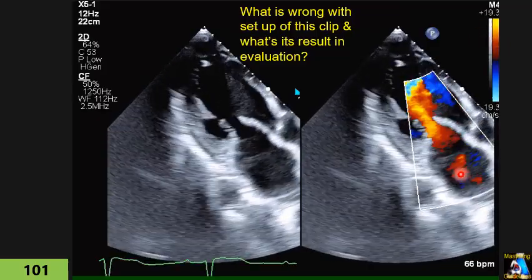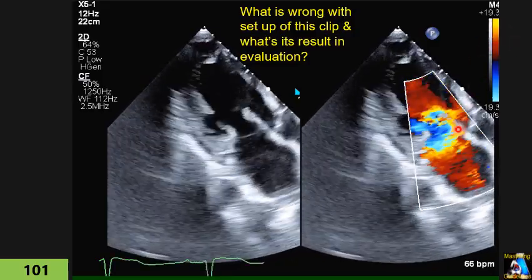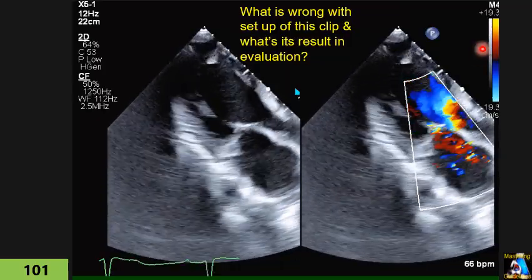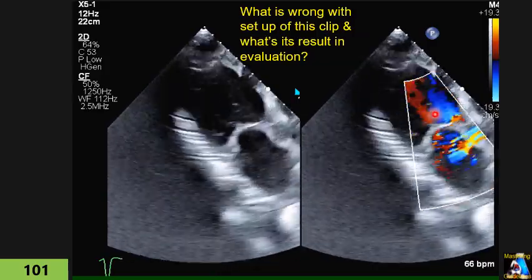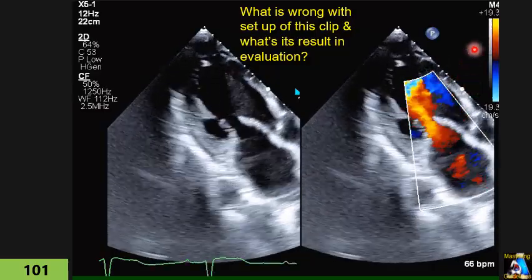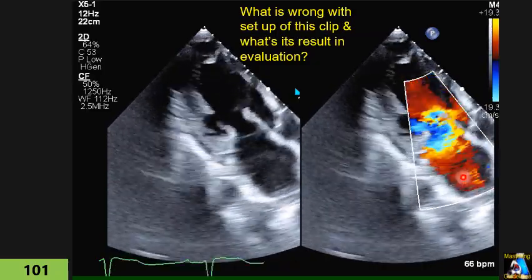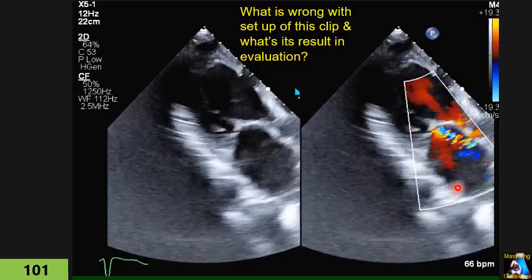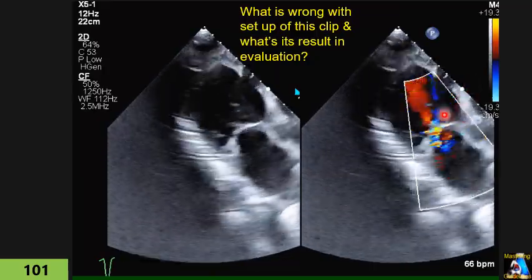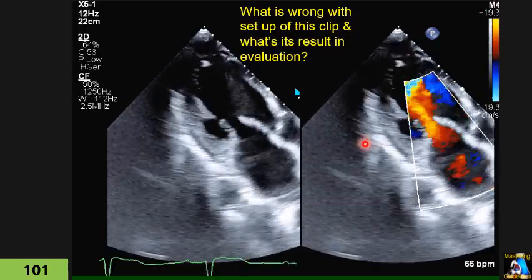In that case, first of all, it creates aliasing, color changing. When you decrease the scale in an area that has high velocity, it creates aliasing, and when you use this setup, you overestimate all the color, like here we have MR, and you overestimate the jet area. I saw some cases, not some, many cases, where they didn't focus on the scale. Just be aware of that.